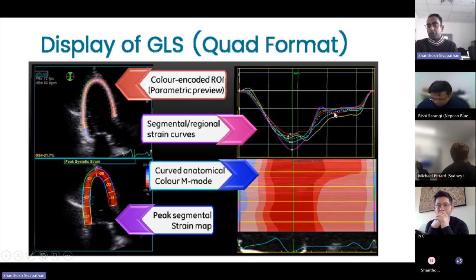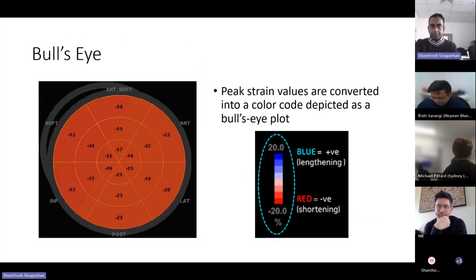If all of the curves are matching and the trough is at aortic valve closure, then you know you've got a reasonably good strain curve or tracking. If one of the lines is off track, you know, hang on, this may not be tracking, or there's something wrong with it. You go back and reanalyze it. If not, then it may be a true reflection of the disease process.